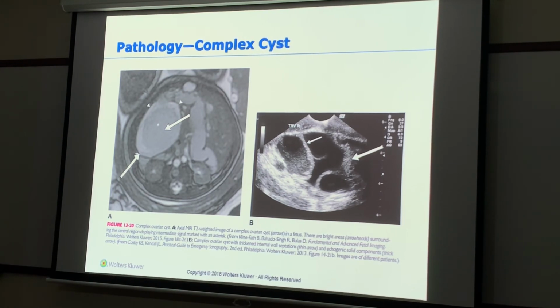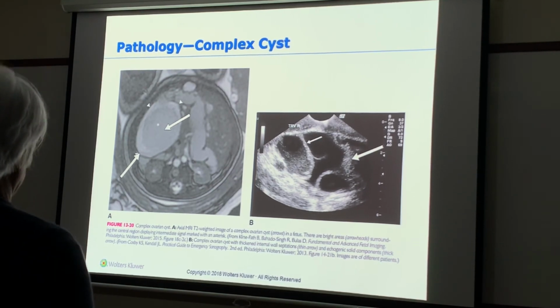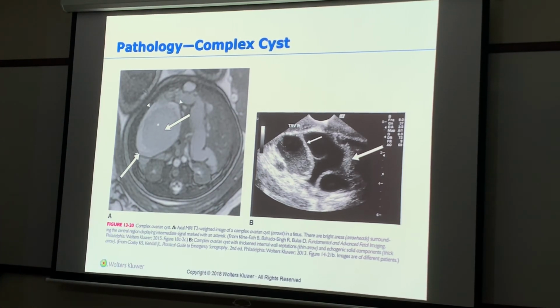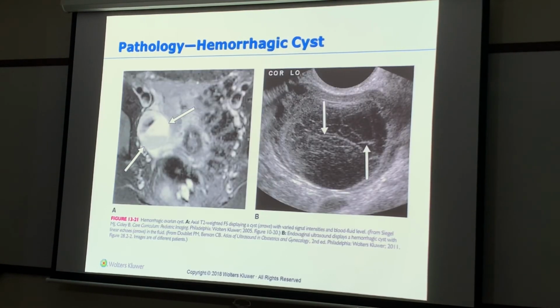That's why it's important that we ask our patients, when was your last period? Are you on any hormones? Because they could be going through infertility treatments. We don't know that. You have to ask. Okay. Ovarian hyperstimulation. Why is it not PCOS? Correct, it's not an ovary with follicles around the periphery, or the string of pearls.